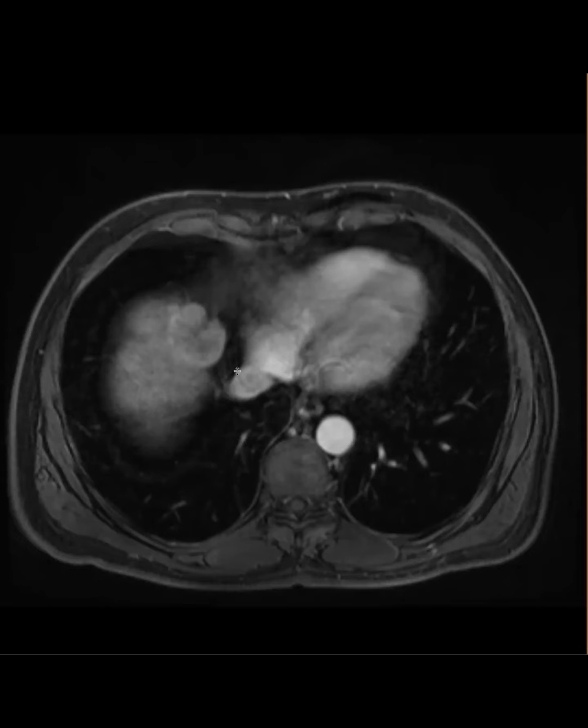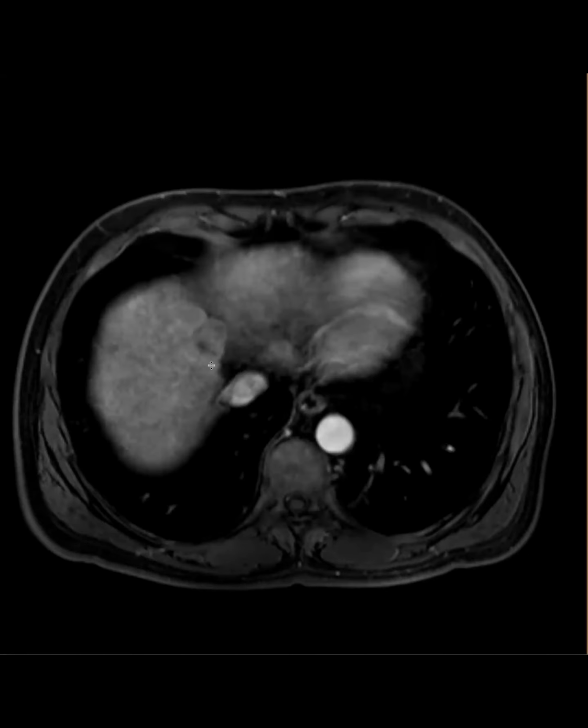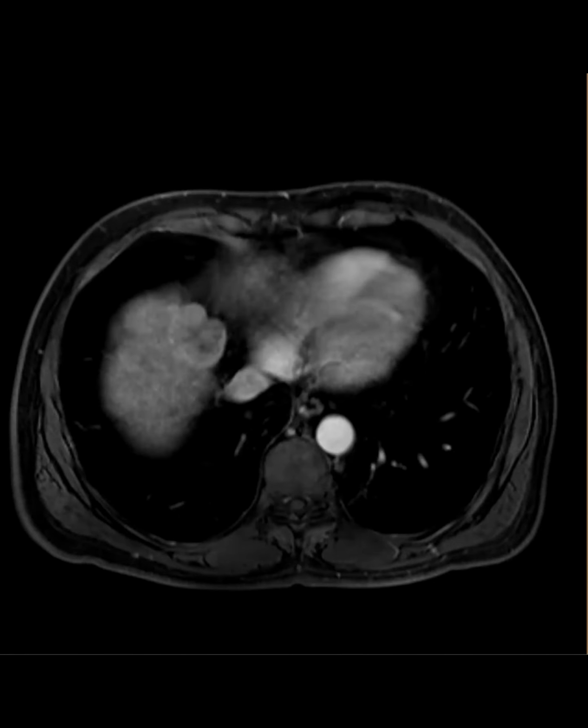The rule is if you're not sure, if there's any doubt, you have to go with rim. So in this case, I would begrudgingly say, okay, I have to give it an M, because based on what you're showing me, I would have to stick with rim arterial phase hyperenhancement and make it an M. But I agree with Aarti that there's a good chance it's going to be an HCC. But strictly speaking, that has to be an M.